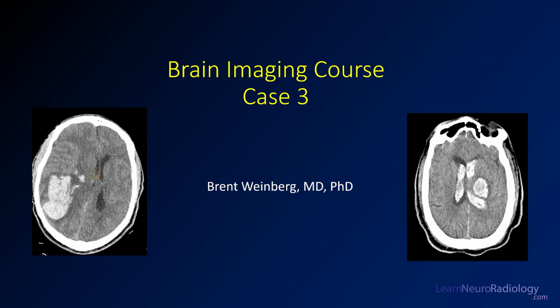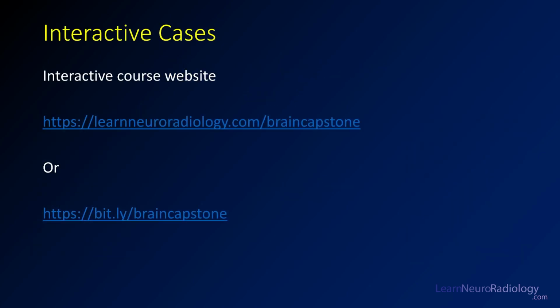Today, we're going through case 3 of the brain imaging course. We're going to take a look at this case and walk through it in an interactive fashion. So let's go. If you haven't been checking out these cases, you can check them out at the website.